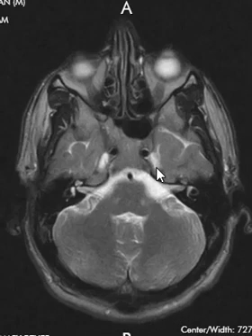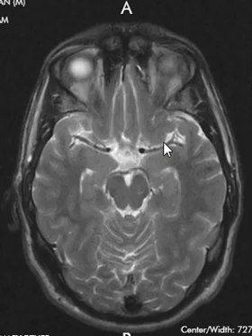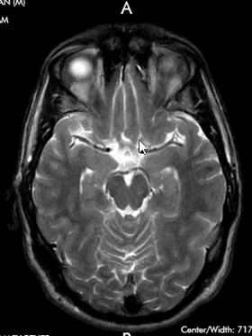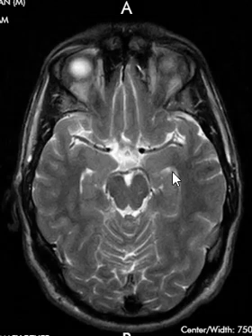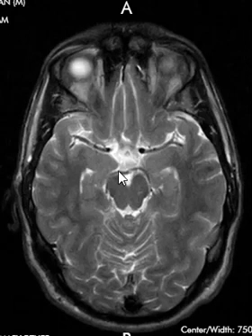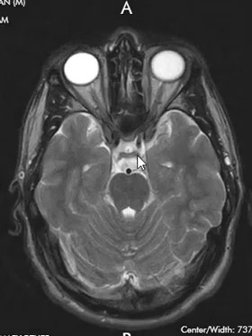If we follow that circulation up, it goes up, up, the internal carotid arteries will end and give rise to this and this. This is the left middle cerebral artery, right middle cerebral artery, and if we keep going up, they give rise to these. These are the anterior cerebral arteries. And so we look there and say, do we have nice flowing blood, which is just jet black? And yes, we do in both of the internal carotid arteries. The basilar artery here looks good. It gives rise to some posterior cerebral arteries. So really just kind of glance there, make sure that there is normal darkness, which is flowing blood in there.